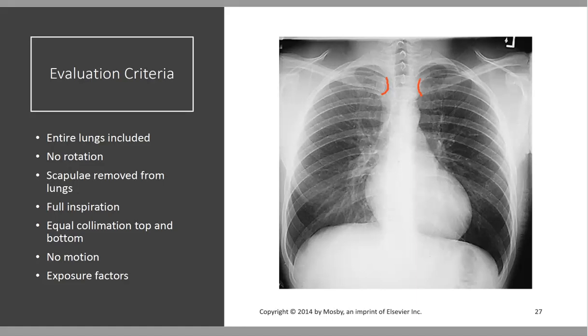Now we have the spine coming down here, right? Here's the C-spine. Kind of see the T-spine. It kind of disappears a little, but we can still see some of it. And then here we have that carina there. This is a pretty good image to be able to see that carina, that bifurcation, which means this is the hilar region of each lung, right? But anyway, if these sternal ends here are not equidistant or basically equal looking on each side of our spine here, that's going to mean we probably have rotation.